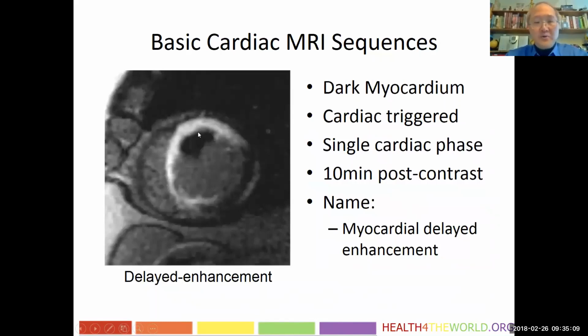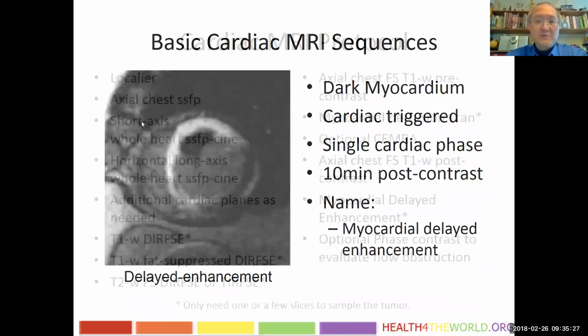Now, some tumors will retain contrast just because the capillaries are leaky, with disorganized entry into the mass itself. So it could retain contrast, and one prototypical example would be fibroma. It has a very avid and very striking appearance in delay enhancement.